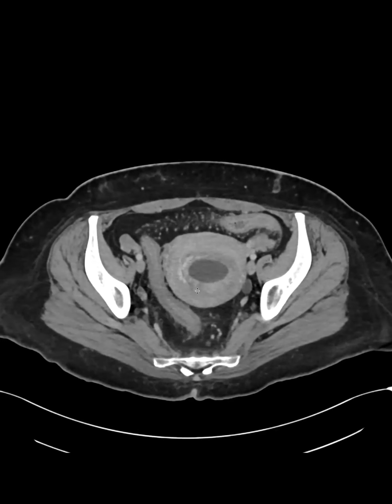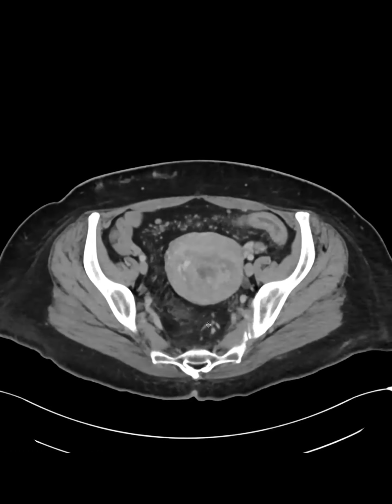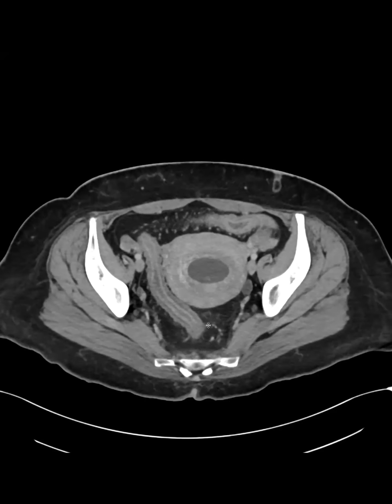So the endometrium is right there, and that's the decidual reaction that Aarti was referring to. And this is the intrauterine pregnancy that was confirmed on subsequent ultrasound. So wait, they don't routinely check betas? Well, we didn't wait for the labs to come back; it was an ED patient. I think we don't routinely check everybody. We ask them if they think they possibly could be pregnant, and if the answer is no, then unsuspected. We don't check an HCG in everyone.